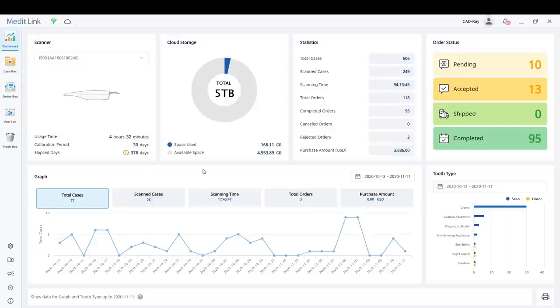I can attach a zip file, DICOMs, STLs, and photos to the patient chart, and they're saved there and synced across the cloud, so I can go to any other computer, log in with the same username and password, and have access to everything. Whereas I'd spent a lot of time searching for cases on the server, on a local PC, not knowing where I'd saved something and where I could find it.